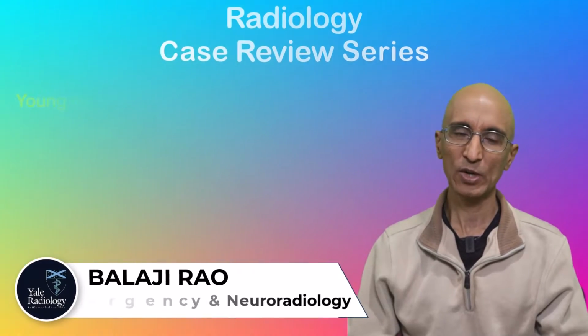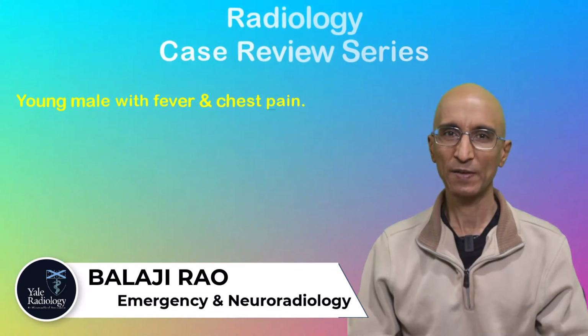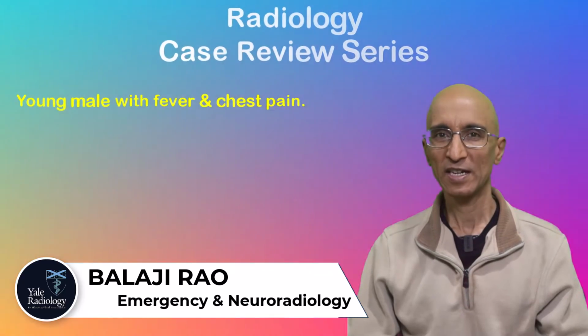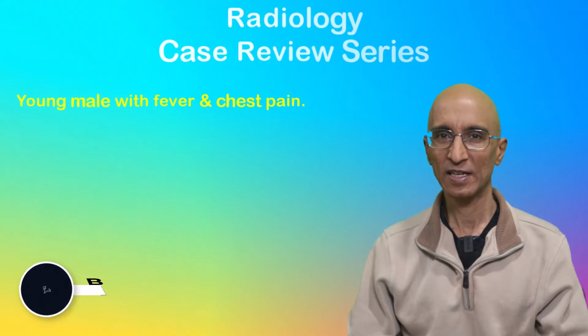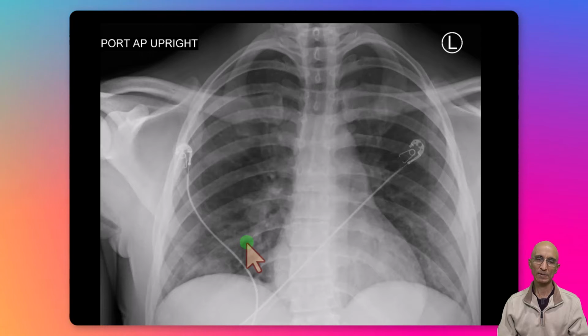In this video we are going to look at a young male patient who presented to the emergency department with fever and chest pain. The patient initially underwent chest radiograph examination in the emergency department. On the chest radiograph we can see some patchy opacities, most conspicuous in the right lower zone. The patient was very unwell, so the clinical team decided to proceed with CT of the chest for further characterization.